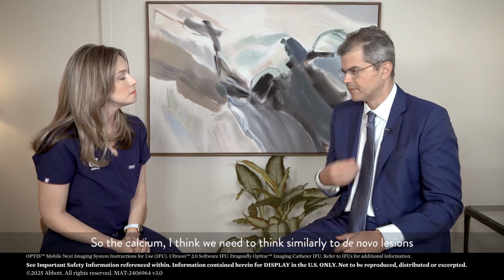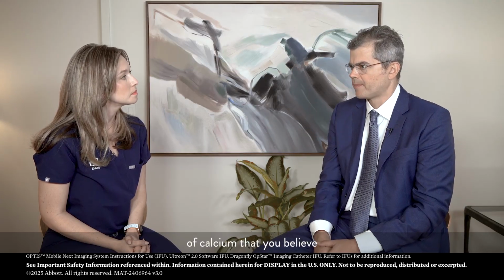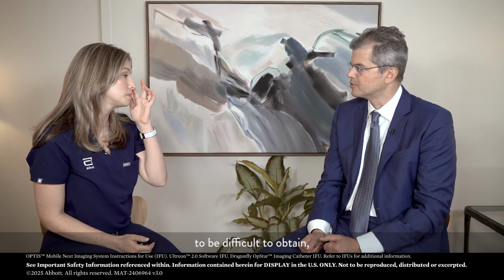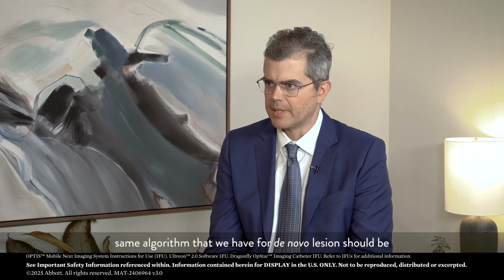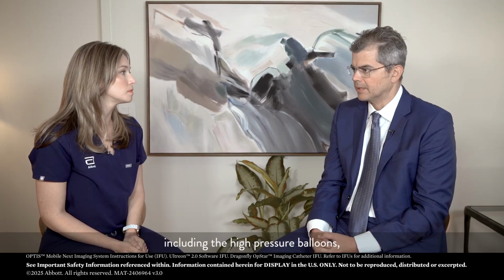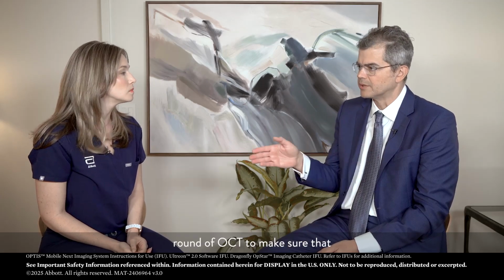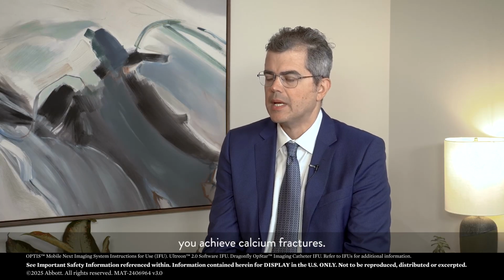So the calcium, I think we need to think similarly to de novo lesions, that if you reach thresholds of calcium that you believe calcium fracture is going to be difficult to obtain, the same algorithm that we have for the de novo lesion should be truly considered, including high pressure balloons, probably a second round of OCT to make sure that you achieve calcium fractures.